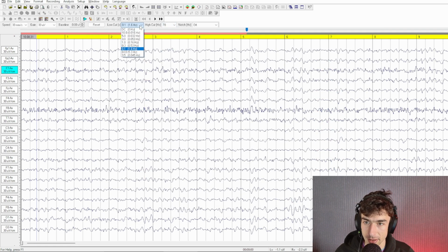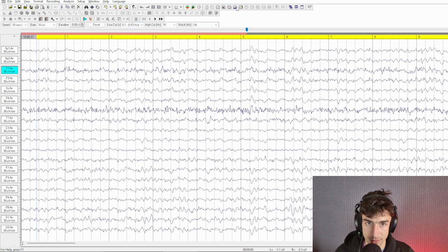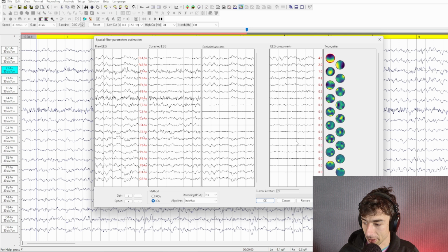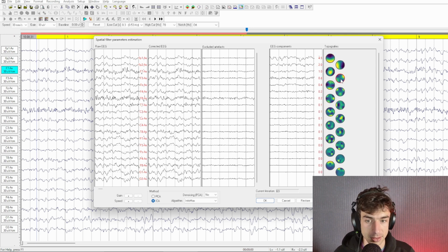I'm going to turn the high cut up and drop the low cut back down and see if that makes this any better. After that, I'm going to stop playing around with the algorithm and just do the best that we can.